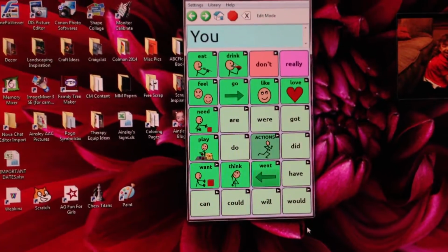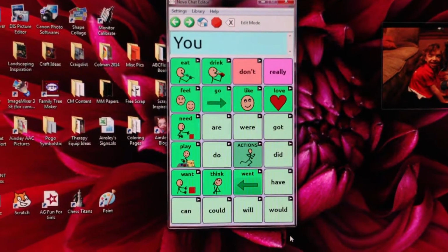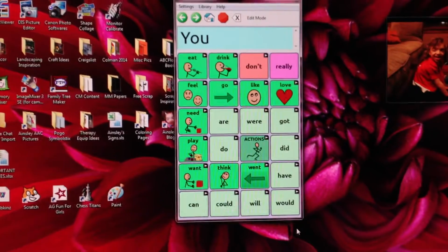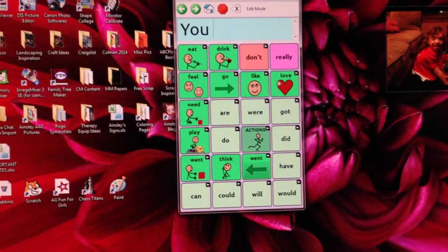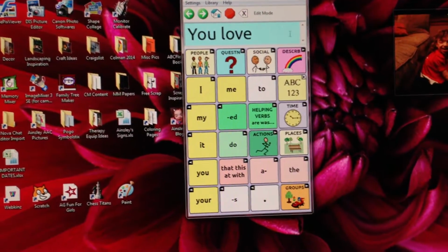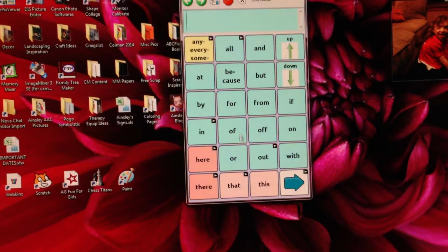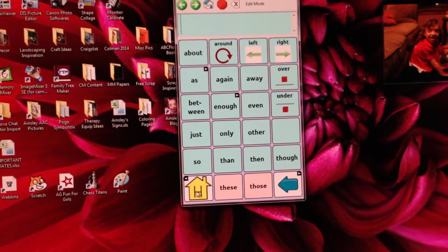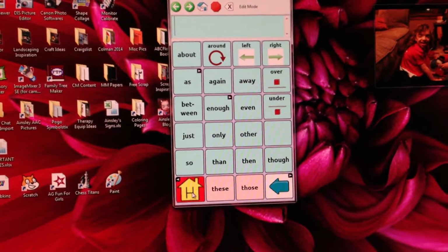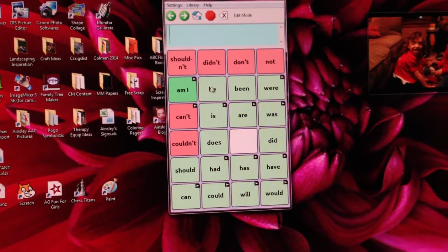There's no "and", and not only that, there's no home button. So how do I get back to find the word "and"? Well, I could press this and then hit clear, and then I can go here. Oh, but that's not in there either. So now here I've got a home button. So on this page they did put one, but for some reason, okay, now I'm stuck again.